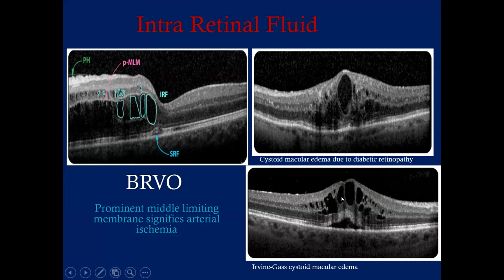And this above one is a patient additionally having a finding like hyperreflective material in the intraretinal space. This goes with most likely hard exudate. But you see lesions down there, intraretinal fluid, multiple cystic spaces with subretinal fluid, but there is no such marked hyperreflective material. It goes with Irvine-Gass syndrome or CME following cataract surgery. This is the way that you differentiate, and proper fundus findings also help you differentiate cystoid macular edema from DME and from post-cataract surgery, because the treatment is quite different between the two entities.